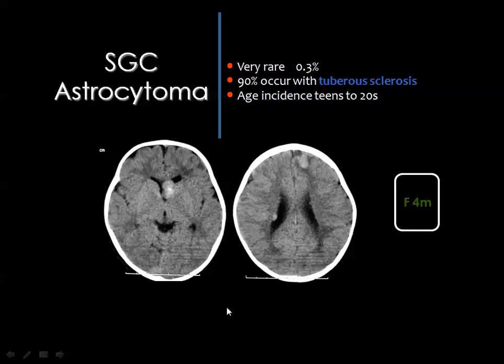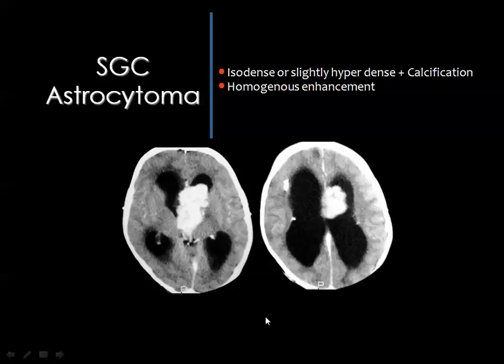And this tumor will show homogeneous post-contrast enhancement and it will contain calcium. And this is an example for the diagnosis of this tumor, subependymal giant cell astrocytoma. You should see in the CT or MR studies manifestations of tuberous sclerosis in the form of subependymal tubers which are calcified. And this tumor is located in one of the frontal horns.